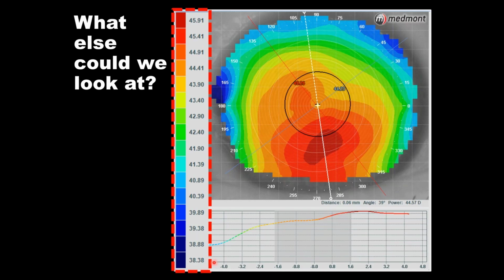So there is approximately a 7, almost 8 diopter distribution of power across this cornea. Now we know that normal corneas have about 10 diopters or less of power distributed. So this patient is in that less column, at least in terms of the power distributed across the eye. This would be considered a normal distribution.